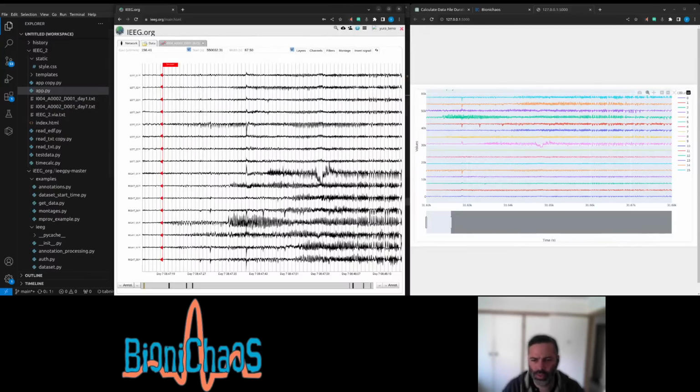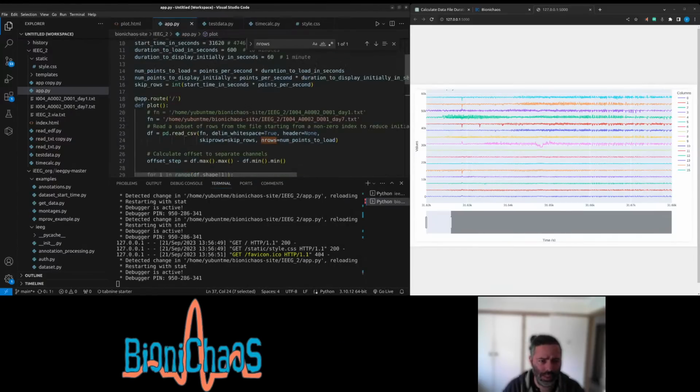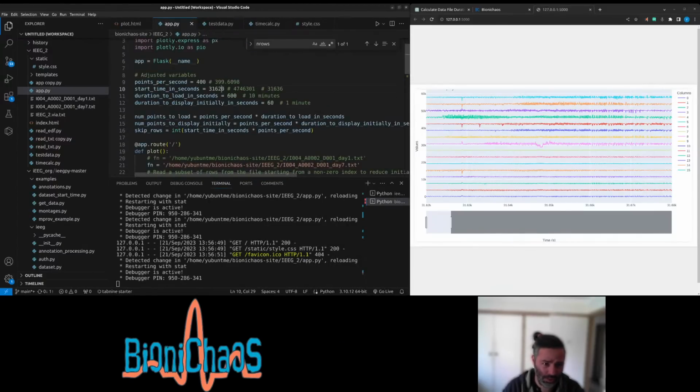Okay, first of all, we have the seizures actually starting earlier. So I don't know, my times don't match as per usual.